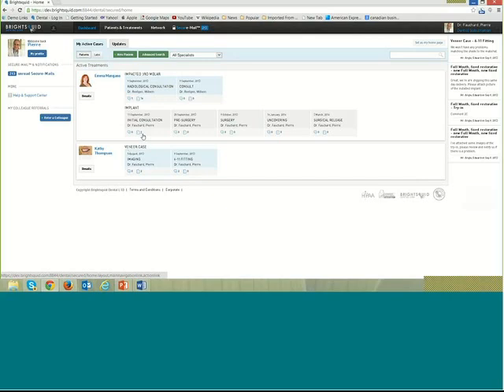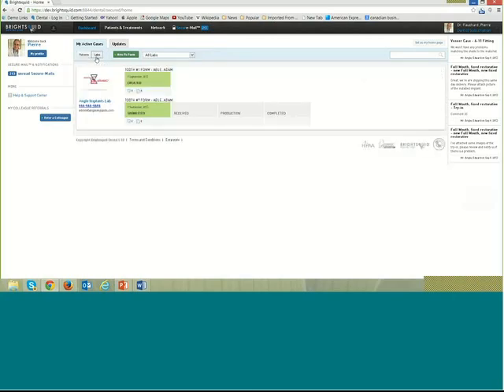In this system, it's broken up into two phases. The first phase has to do with the treatment that's actually being delivered. And in this case, it's an implant treatment. And as the stages progress, you'll see this highlight in different areas and specific digital assets be attached to each of those specific stages. So in this case, for example, we've got a couple of comments and a number of assets. Then what I can do is I can switch it to a lab view.